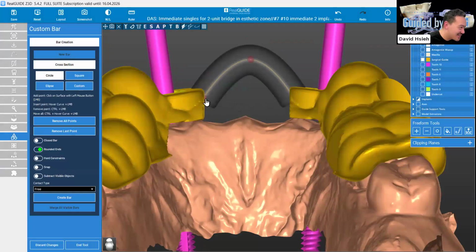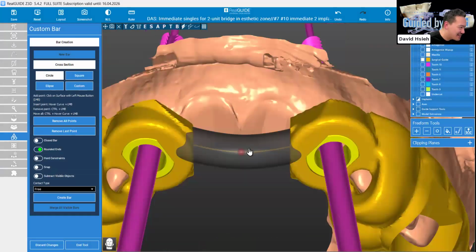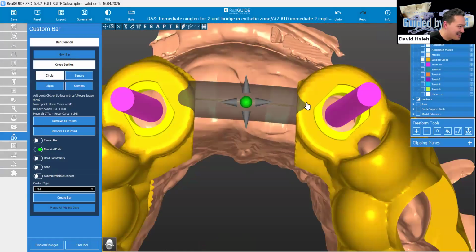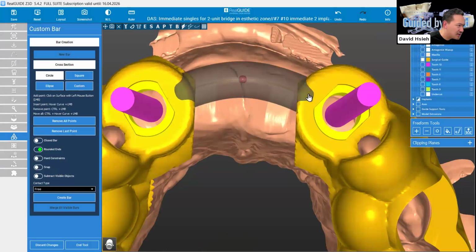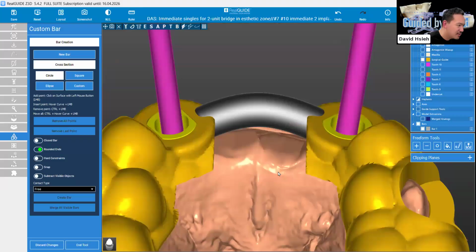Right. This is so cool. I love this function. That's one of the reasons I love you guys so much. So doing this, we're reconnecting the two guides into one, right? But we're only connecting one, he just created a bar and it's almost there.